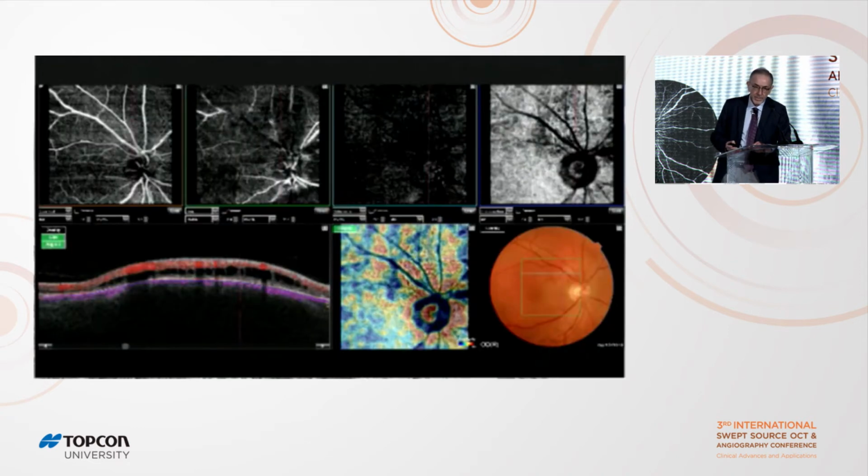And this is the OCTA image. Basically, the superficial retina, deep retina, and outer retina are unaffected, as you can see here. And when you increase the choriocapillaris slab to see the choroidal tumor, you can see the interconnected intratumoral vessels here nicely.